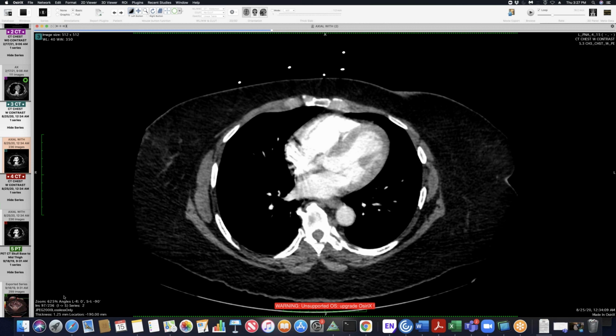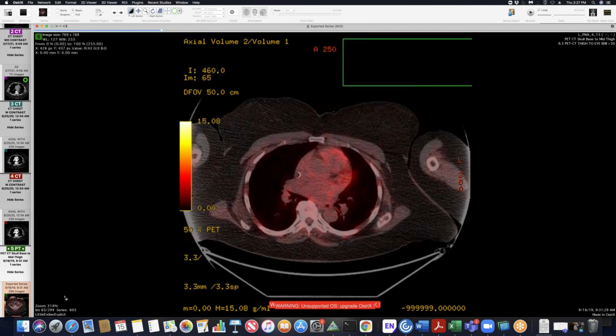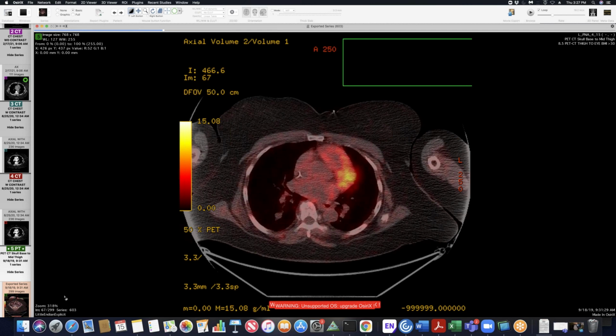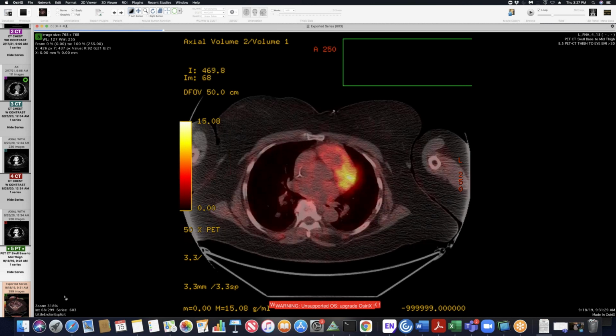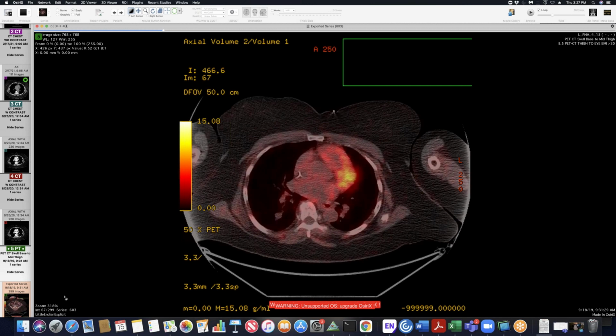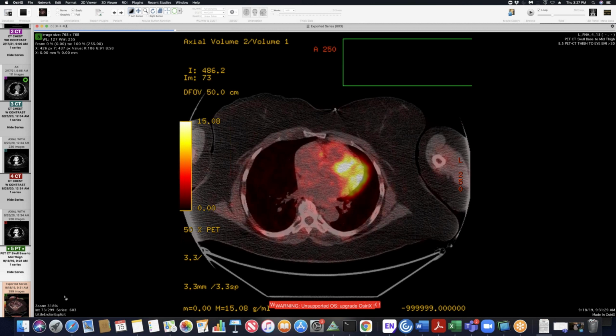I think there could be a component of mucus plug here too, given the elongation. Both proximal and distal, perhaps, interestingly. Yeah. So I've seen aspirated foreign bodies cause a mucus plug like this. I've seen benign tumors, including endobronchial hamartoma, do it. And I've also seen a small cell lung cancer do it. The small cell lung cancer was too small to be seen, but it formed a little bit of a mucus plug around it. So I think until you sample this, you don't know what's causing this.